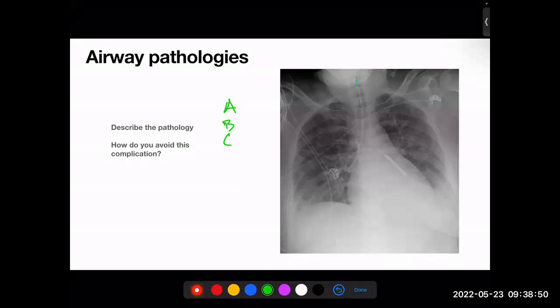Yes. Anybody? Hello. Yes, doc. What is that? Look at this. It's coming through the trachea, and then it's going into the right main bronchus, twisting upon itself, goes back, to the left main bronchus. What is this? This is a nasogastric tube.